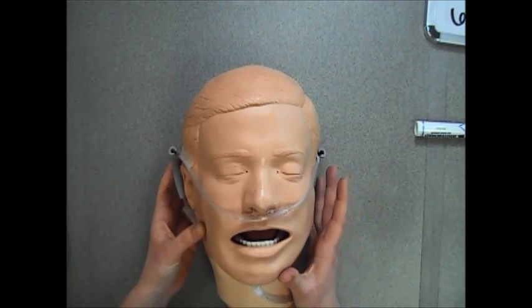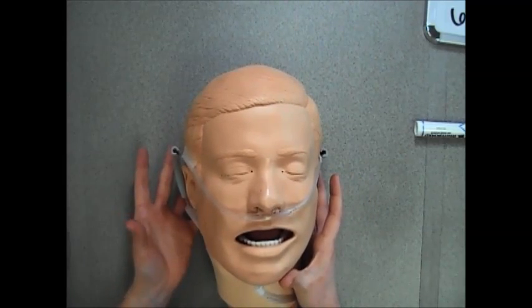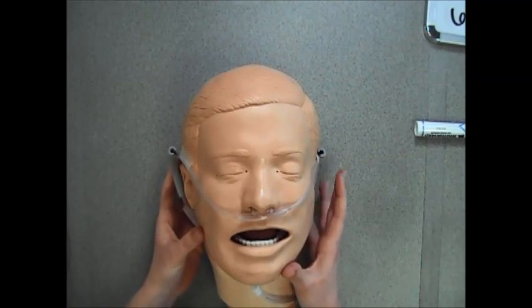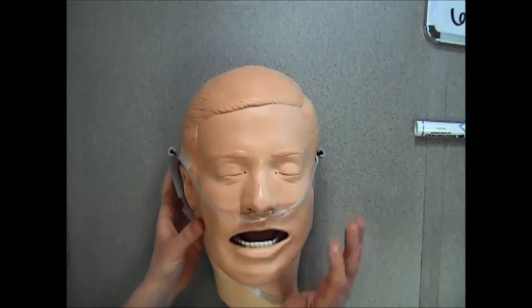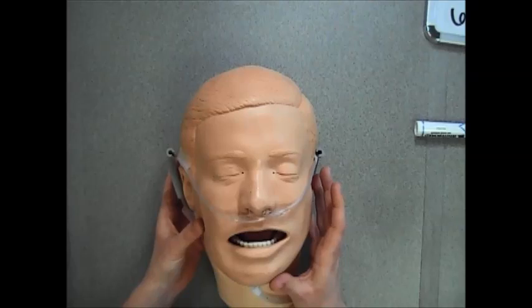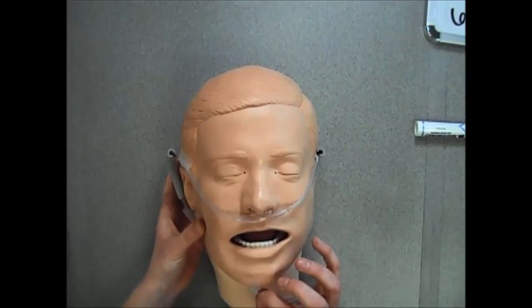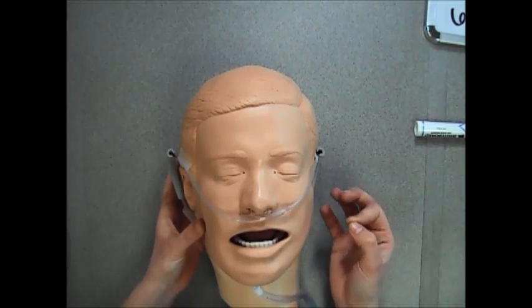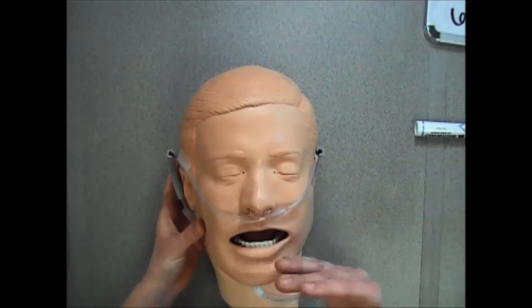eat, or cough. When you are using a nasal cannula device, there are several considerations that you want to take into account. Policy states that humidification may be necessary for any flow rate that's greater than 2 liters of oxygen per minute. For any flow rate less than 2 liters of oxygen per minute, humidity can be used, but really only if the patient requests it for any kind of nasal irritation or dry nares.